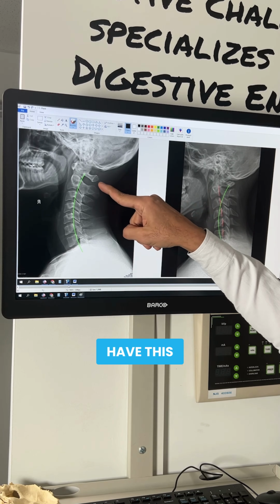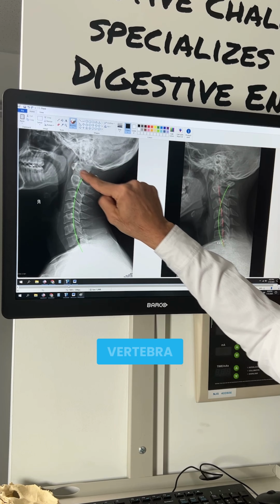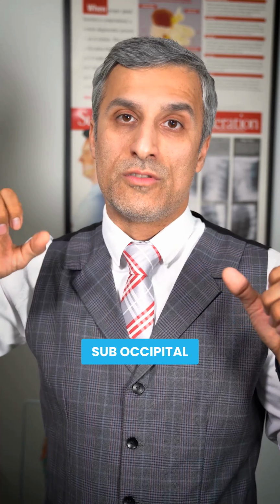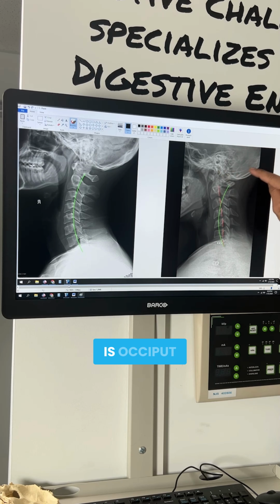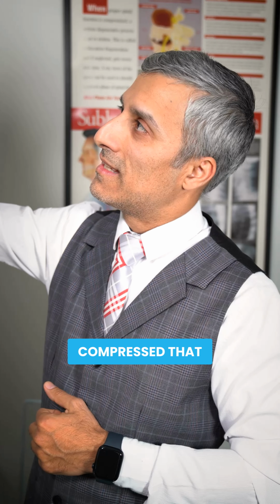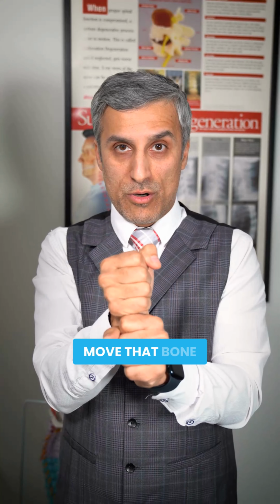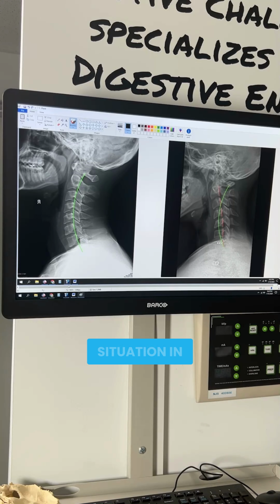The second is this bone that's called the atlas. That's the first vertebra. In between the skull and the first vertebra, we have a space. There's a nerve that passes through here, which is called the suboccipital nerve. If it's compressed, people feel headaches. So in her case, this bone and the skull, which is the occiput, are so compressed that, in my experience, when somebody is having pressure on the nerve due to a mechanical issue, and we can move that bone and take the pressure off, the pain goes away and the headaches improve. As long as they can improve their posture, they will see improvement in their symptomatic situation in their spine.